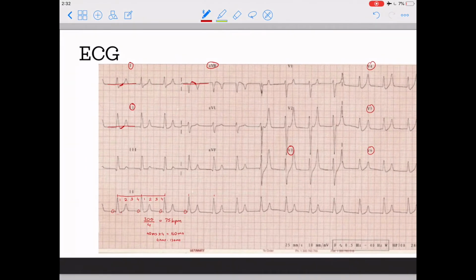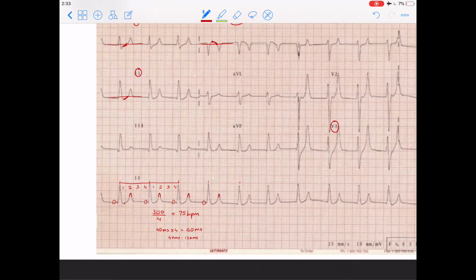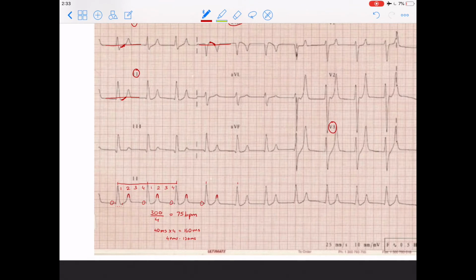Okay, so we've gone through the 6 steps of interpreting the ECG. Let's see if there are any other abnormalities in the ECG strip here at the bottom. An important finding here is that there are these tall tented T waves. So we see these tall T waves there, there, and there, and this is present throughout the entire ECG strip. T waves are normally supposed to be broad. However, in this case, they're narrow and they also have a peaked form.